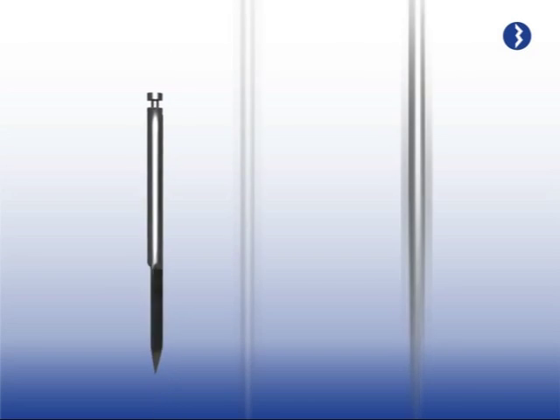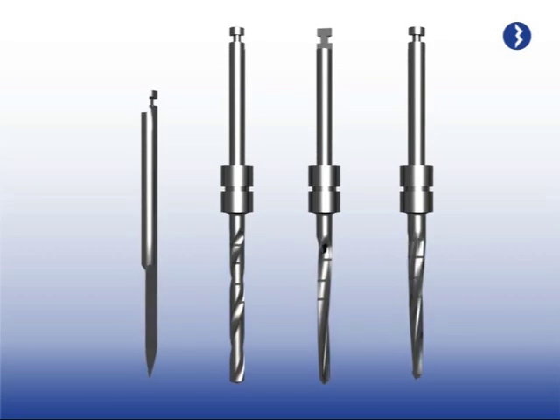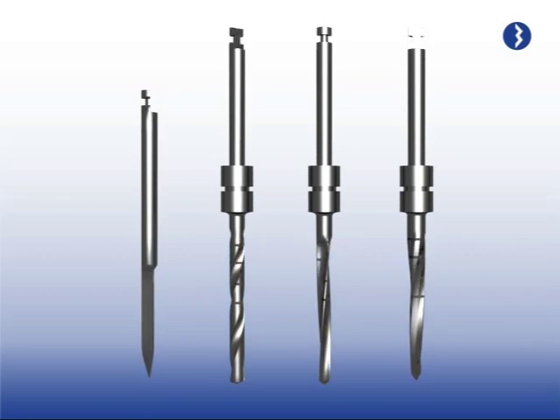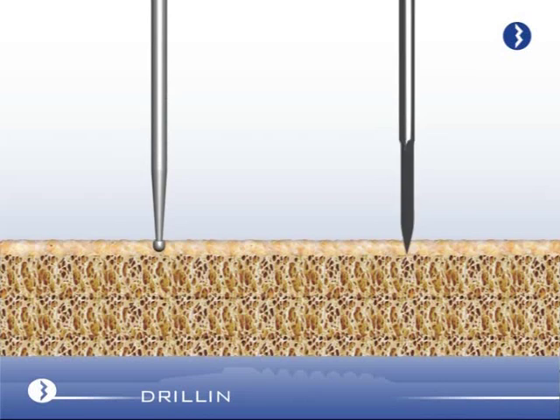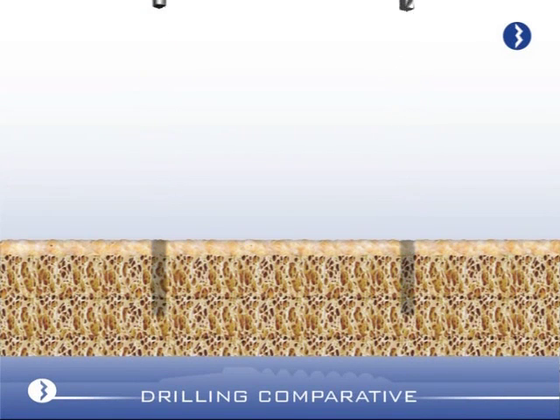The Q implant coil design is different from traditional implant systems in that it helps achieve a reduced number of drillings. We can see a comparative scheme between the Trinon system and traditional systems.